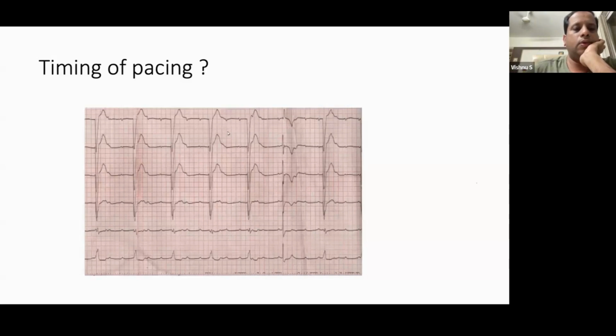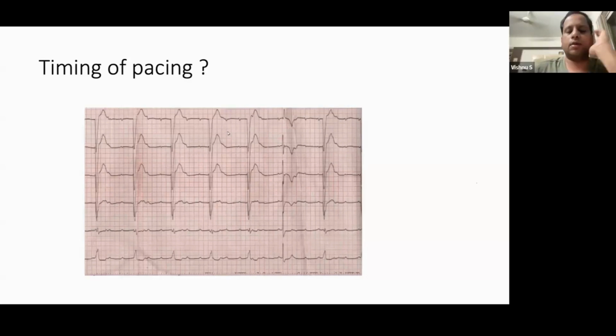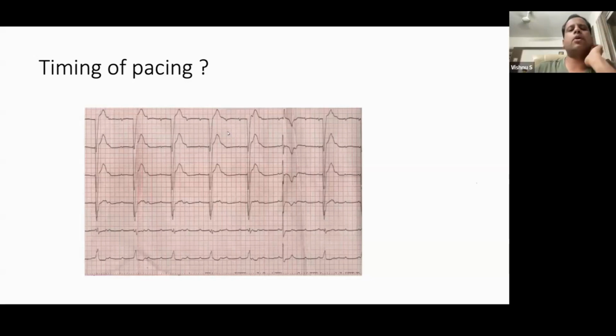Complete heart block with the broad QRS complex escape. Yes. Can you apply the four things I told you? Is it correct for this patient? PP regular, RR regular, more P waves, no definite P to QRS relationship. This is a broad QRS escape, which, as already told, is not a stable escape. So this patient needs a pacemaker as early as possible.